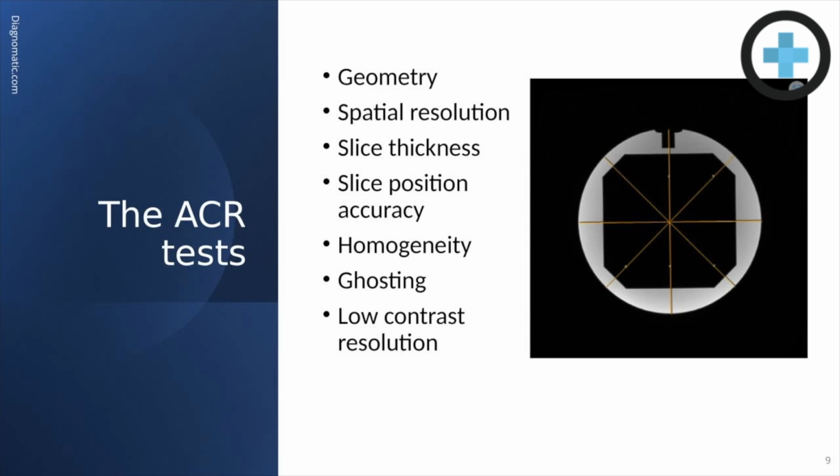And then the various ACR tests that we'll be looking at today.